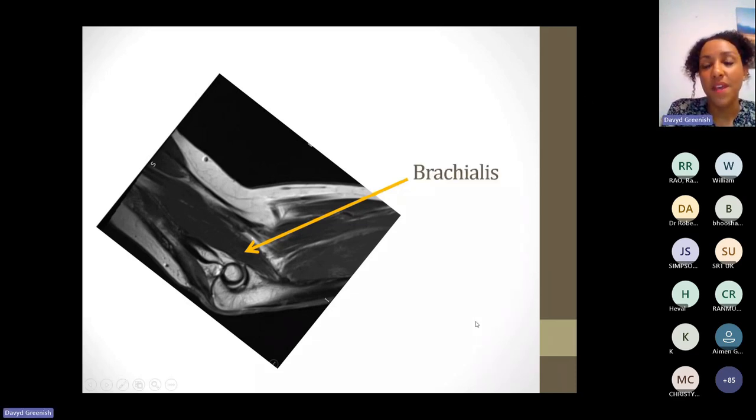This is the brachialis muscle, and you know it's that because it's relatively deep at this point at the elbow, and you can see the biceps is up here, so don't mix the two up. If you've got a more superficial muscle, you can see the tendon coming off, which, you'll just have to trust me because I've seen the whole MRI for this patient. It is running down and will insert on the proximal radius, as we've already talked about. So a muscle that's clearly heading down towards the ulna, it's not going to be the biceps brachii tendon. The muscle is brachialis.